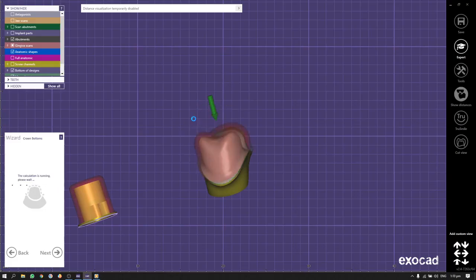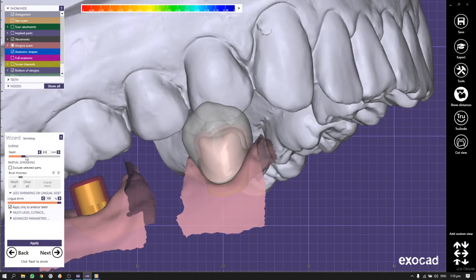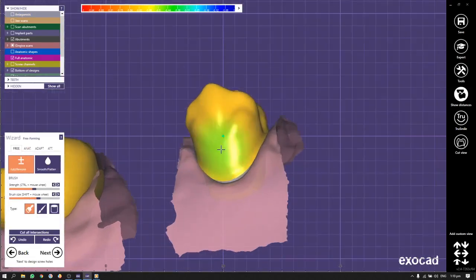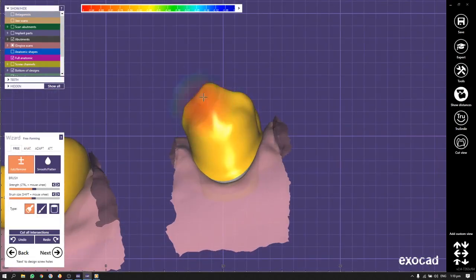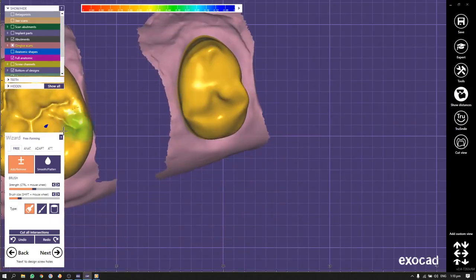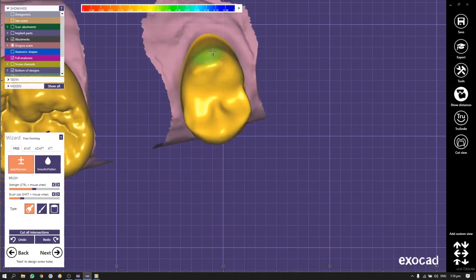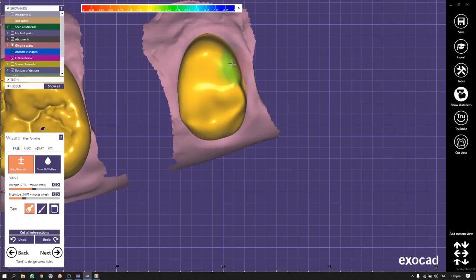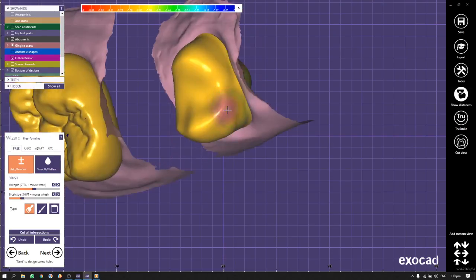So we can make, for example, just a cutback of the buccal surface, or turn it into a cap for the complete layering. We press next and we get this kind of cap that we can also smooth. If in the archive I had pointed out not full anatomy reduced, just full anatomy, we wouldn't have the cutback step, but in this project we had full anatomy reduced. Initially we chose this option. We can smoothen it out, we can add, and press next.